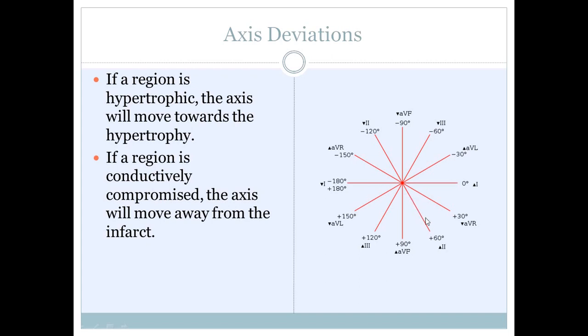And that's going to be seen as a deviation from the line formed by the entirety of lead 2. The signal originates at the center of the heart, or the sinoatrial node, which technically isn't the center, but for schematic purposes, that's what we will say is described by this meeting point.